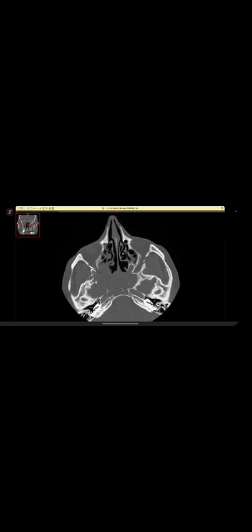the candidate did very well, pointing out that the lesion is going into the pterygopalatine fossa. But please remember in the exam, they are not going to be satisfied just with this word because they are going to go into details of what is happening. Because everything was destroyed here, the viva went into normal anatomy, and this will happen in the exam. Many a times they will ask you normal anatomy.